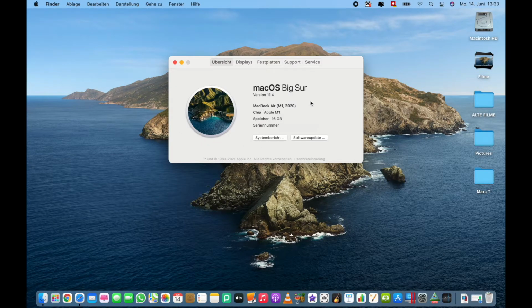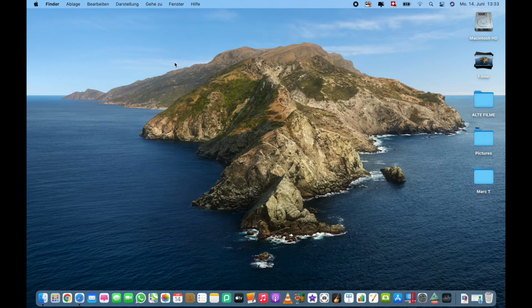Here are the system specifications. I'm running macOS Big Sur, which is version 11.4. This all runs on an M1, which is the new Apple silicon chip. It has 16 gigabytes of RAM. I think this system resembles a lot of systems that customers may use to run the ActiView. So I'm going to show you how this runs with my runtime engine and ActiView software.